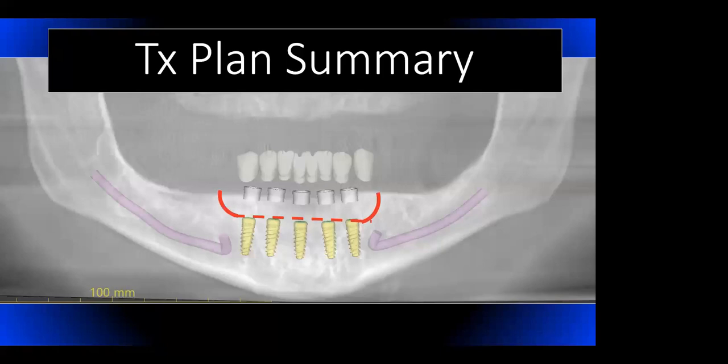And what does that do? It leaves us a large volume of bone posterior to the foramen. We don't want that, especially if we're making a bar. So you want to extend that osteoplasty posterior. If you're making a bar and you're going to cantilever an attachment, you want to extend it beyond that, because what you don't want is the attachment running uphill.